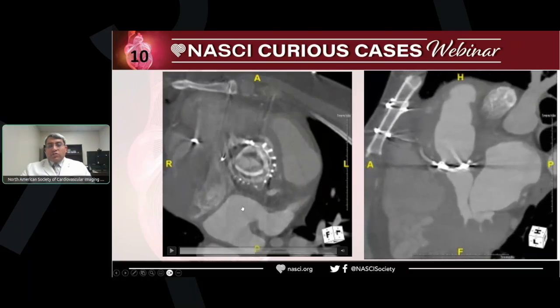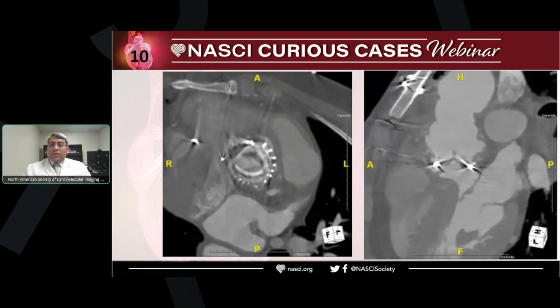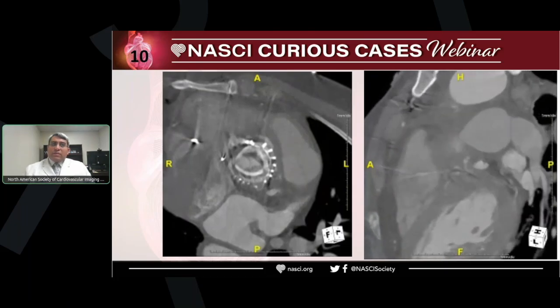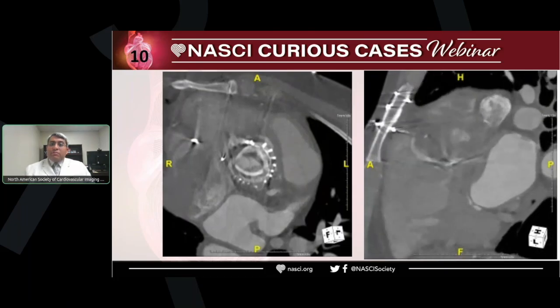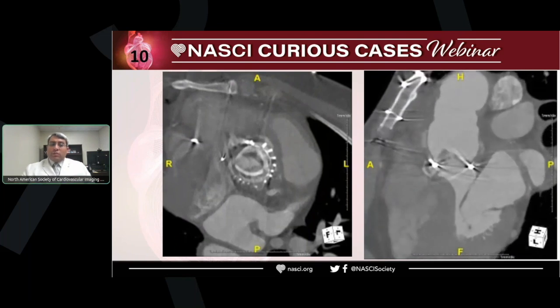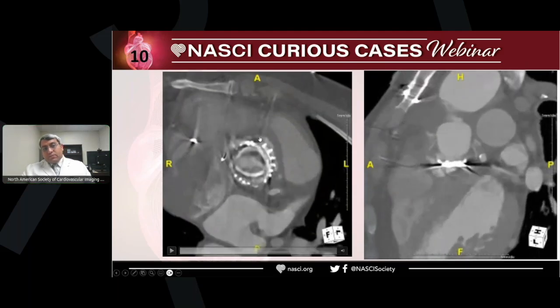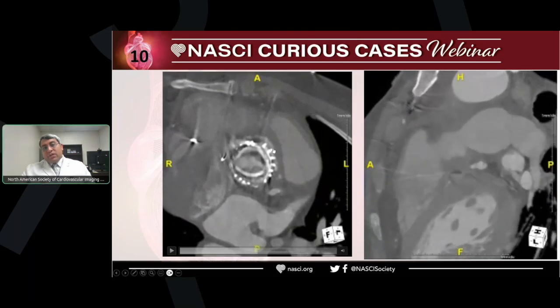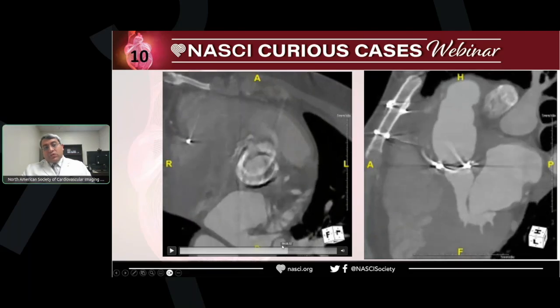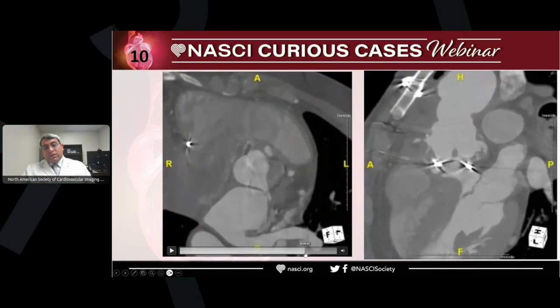So definitely I agree with you that this is a post-surgical case. It is very important, as a lesson learned, for any post-surgical case to have a pre-contrast scan as well, because many of the post-surgical materials are high density and can be mistaken for a peri-surgical leak, blood component, or contrast leak. But this patient has perivalvular contrast coming outside, around the surgical change. You have some here also. We have some here. Yes, around the valve itself.